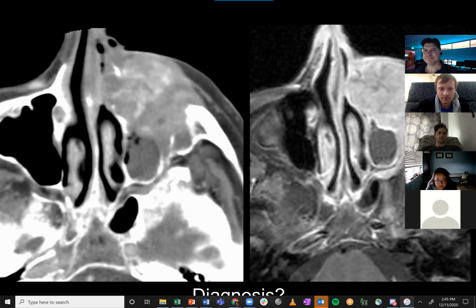So I'm thinking V2. V2, that's right. So where does V2 go? There's a lot of places to look this up, and this is hard. Perineural tumor spread is kind of the head and neck imager's shtick. It goes to foramen rotundum. Where does it go before that? Pterygopalatine fossa. Where does it go before that? Infraorbital foramen, below the eyeball. So it's going under the eyeball back towards the pterygopalatine fossa, and then it goes through rotundum.